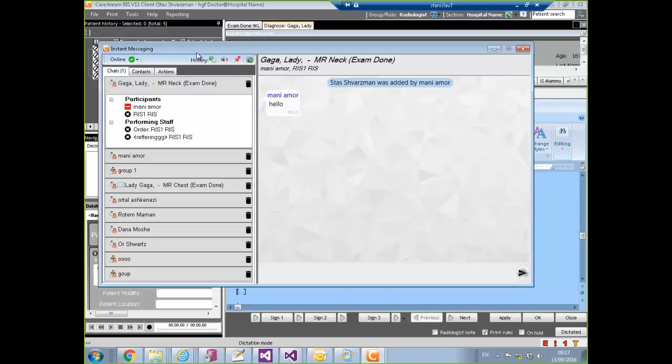Here I have a history button that is not ready yet. It will not be ready for 11.2, it will probably be ready for update 1 of 11.2, the history. Maybe we'll explain something about what is history. As you can see, the user has all the received chats on the left part here, but the user can close the chat, and later will be able to look for all chats that he has in the past using the history button.